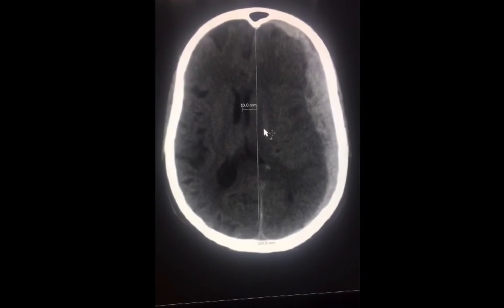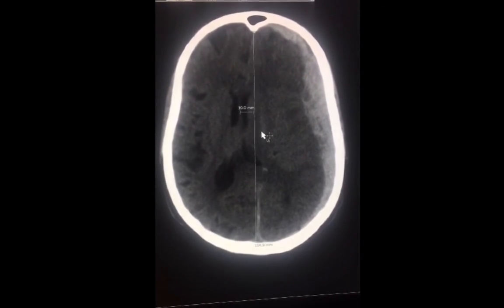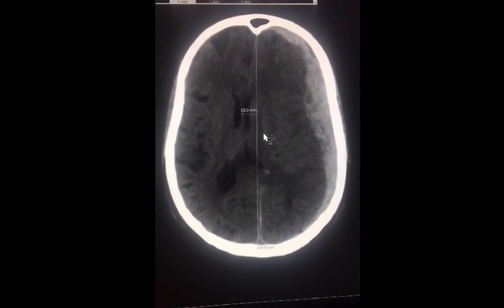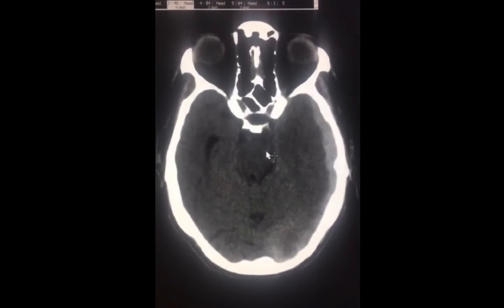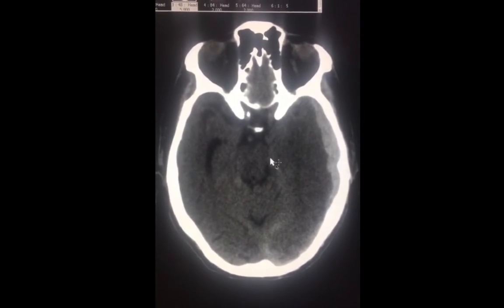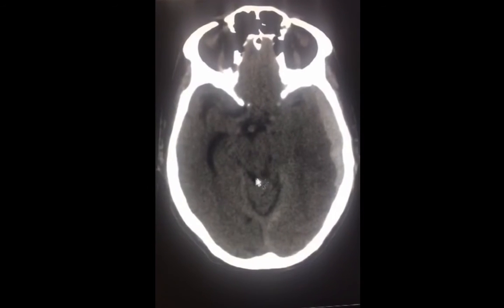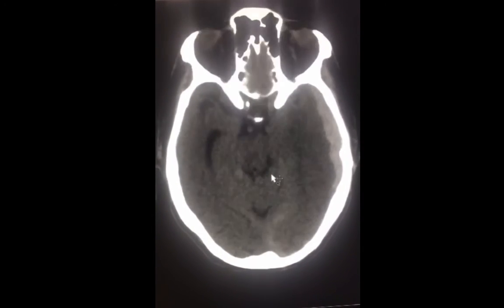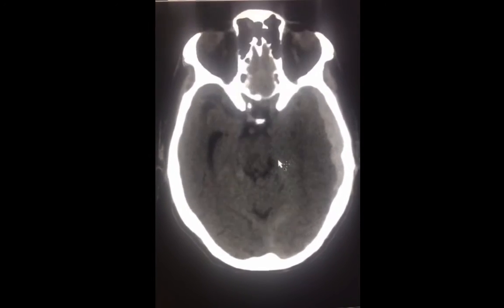Midline shift is also known as subfalcine herniation, as the brain herniates underneath the falx cerebri. Two other herniations to look for is the herniation of the brain through the tentorial incisura, also known as transtentorial herniation. To easily assess for this, check the CSF space adequacy around the midbrain. This CSF space around the midbrain is also called perimesencephalic cistern.